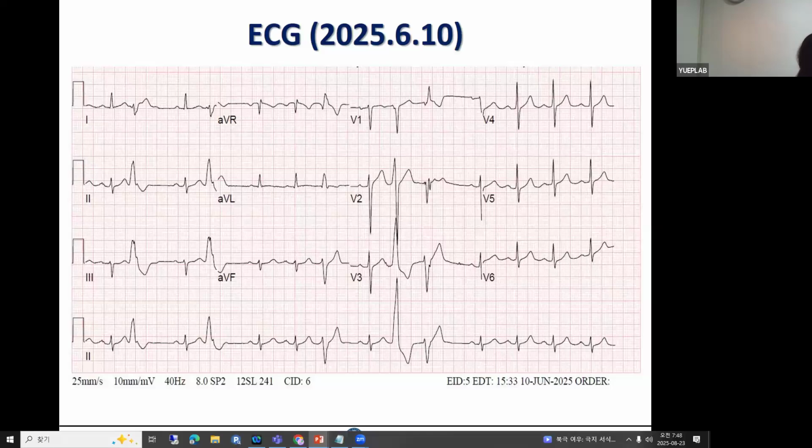Now, what's the interpretation of the ECG? What does the AI say? Never mind. Okay. Now, why does the EKG morphology change so much? Now you got a wider QRS with notching, a lot of notching going on, even a left bundle pattern, right? You see it?